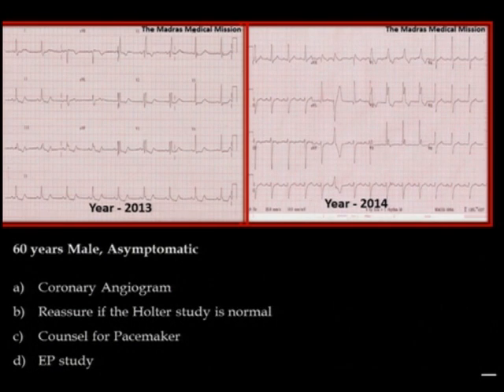But if he is a 60-year-old man, a retired employee, who has been doing very well, I would not do anything more. Only if he asks, why doctor, last time you did not ask for the Holter, this time, then only will I start telling him. I would like to underplay the importance of this trifascicular block in a 60-year-old healthy adult patient. But well, I know that I may be wrong. But that chance of me being wrong, according to the literature, is so very low that legally I will be pardoned if this gentleman gets a syncopal episode the next day.